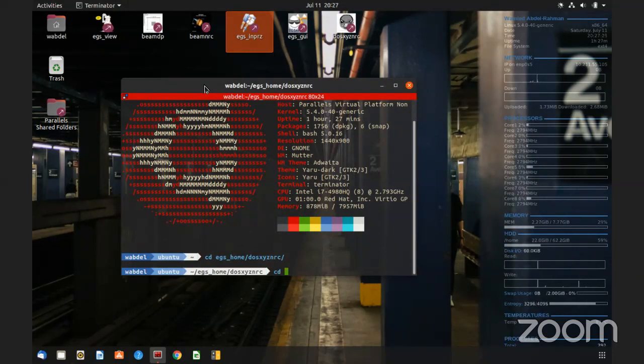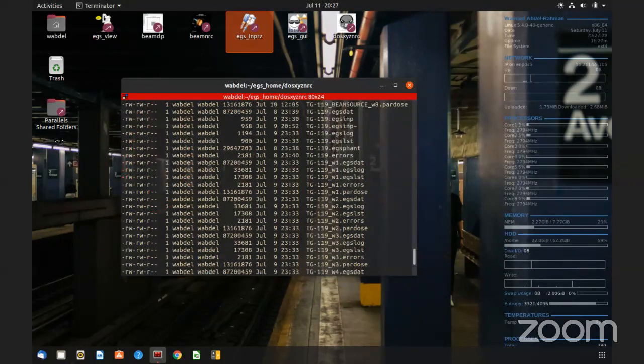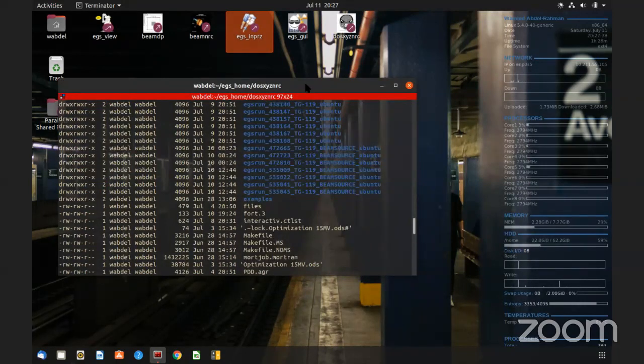Oh yeah, I mean those. Okay, maybe I have it here. LS minus LA. See. Okay. So now these are questions for power users.